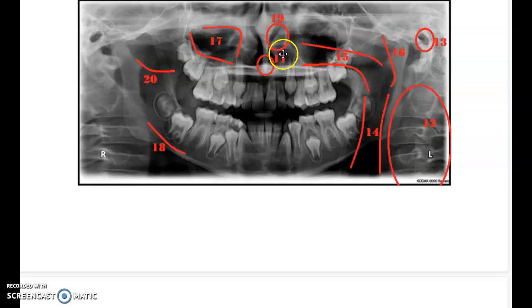Number 14, we're going to move to the glossopharyngeal. So 14, 15, 16, we're going to talk about air spaces. So 14 is the glossopharyngeal airspace, which is a vertical going up, radiolucent band superimposed over the mandibular ramus. The ramus right here. So that's the glossopharyngeal airspace.